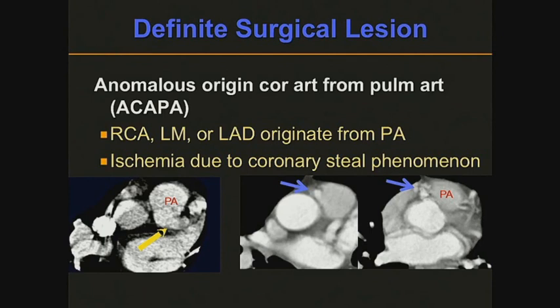So if I look at the RCA, look at the other branch, this is a different patient. You can see basically tortuous vessels. Here's a different patient. We can see the origin of the RCA was coming off the PA. There were a lot of tortuous vessels, got very close to the sinus, but never really communicated with it, and then traveled down. So the flow is a shunt-like flow. And when you look at the opposite vessels, they're actually large too, because they're basically through collaterals providing flow to the PA, and then to the RCA, and from there into the PA.